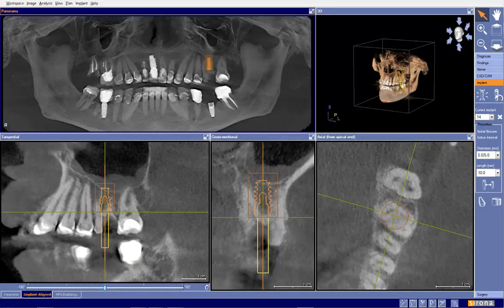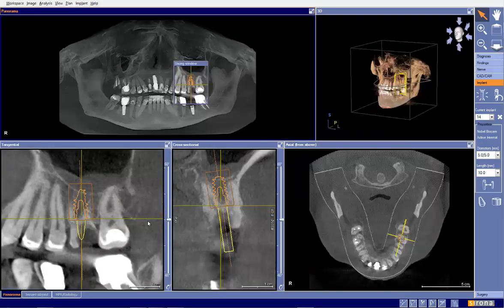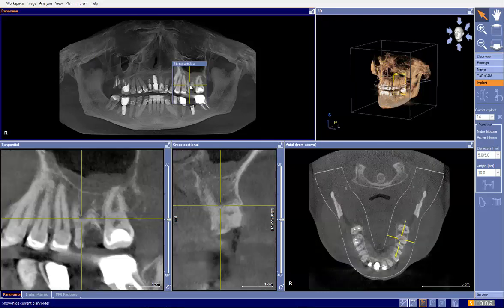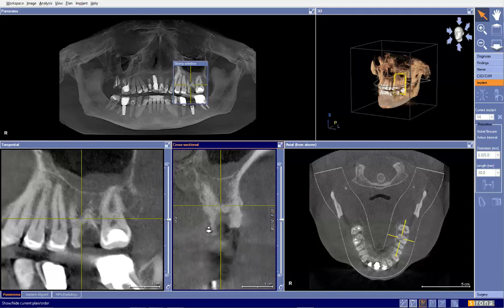So I went ahead and brought up the 3D for this particular patient. I'm going to hide the implant. I want to point out what I'm looking at and how I'm making these decisions, that I believe this would be a site for immediate placement. I do believe we would be able to get tremendous torque on this implant with great stability. Of course, that is all dependent on getting the tooth out atraumatically, keeping the walls intact. But by sectioning the tooth and taking out each individual root, this shouldn't be a problem at all.